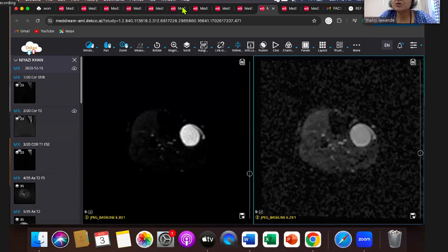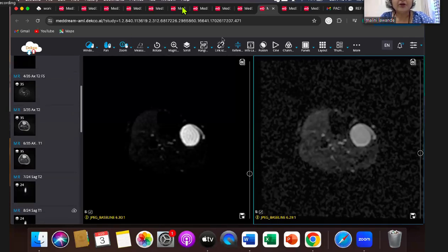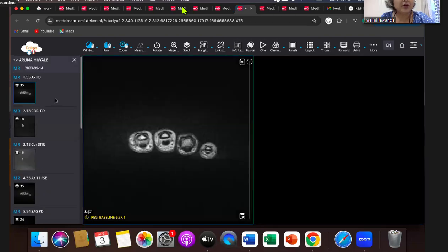Somebody asked whether it could be lymphangioma. Lymphangioma would be more cystic, and the multicystic component will show very slender peripheral enhancement. The cysts will show peripheral enhancement. Here, within the lesion, there is flimsy enhancement. It's not peripheral enhancement. So this is not lymphangioma. Okay. Now that we have looked at this case, let's move to the next case.